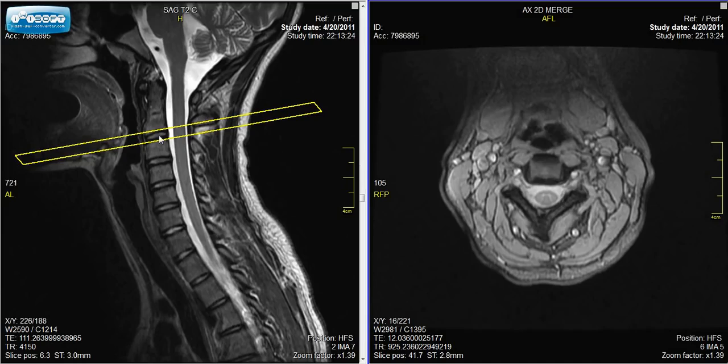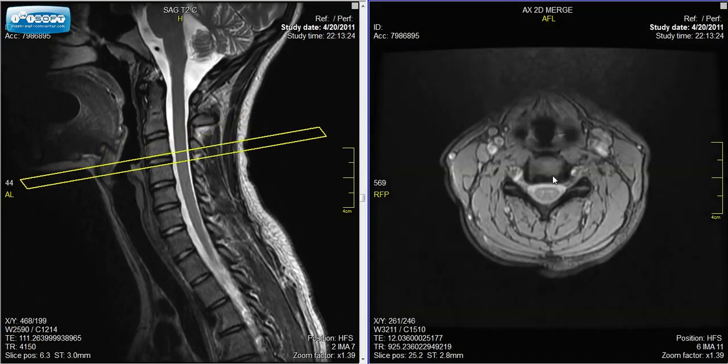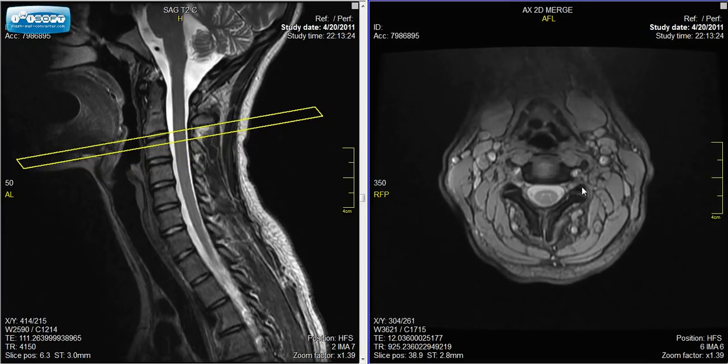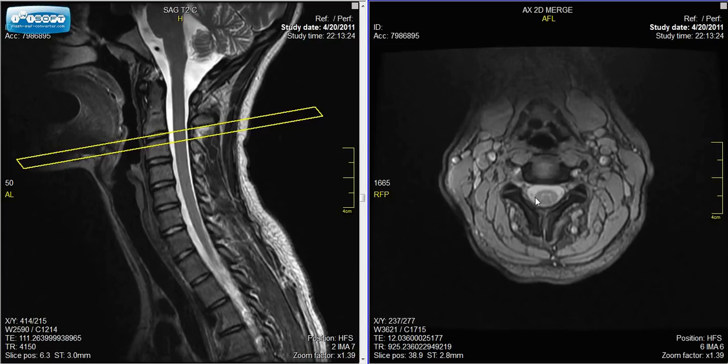This is the spinal column. Again, it would be the disc or the bone depending on where that slice hits it. Once again, we see on the back of the spine the joints, which are called facets, and the joint surfaces are these lines. And the spinal canal is here. Now, within the spinal canal, this gray oval is the spinal cord, and the white surrounding it is the spinal fluid. Now, at every level, we can see how a pair of nerves leave the side of the spinal cord and go out through the foramina.